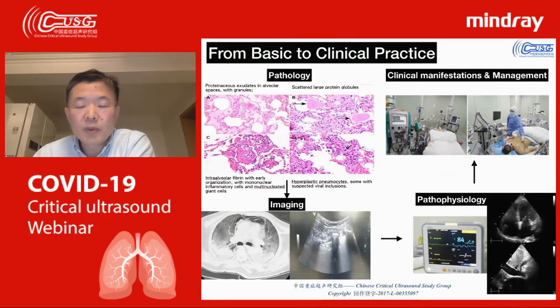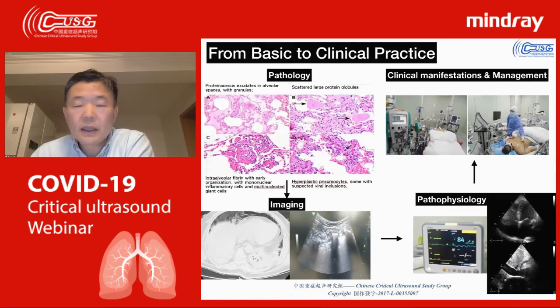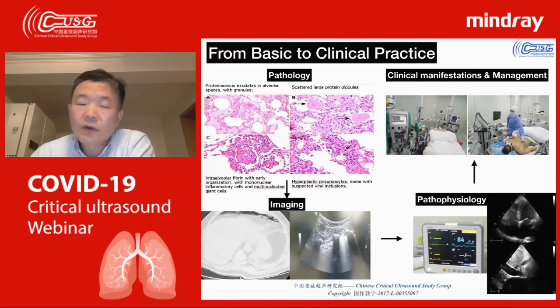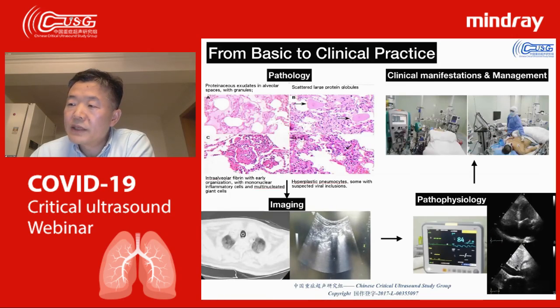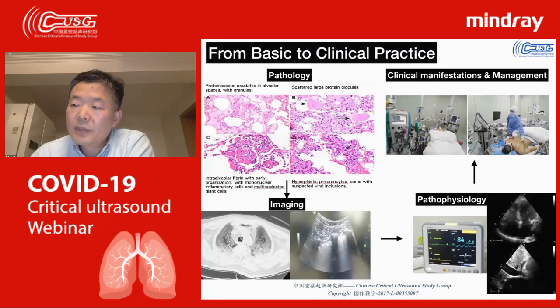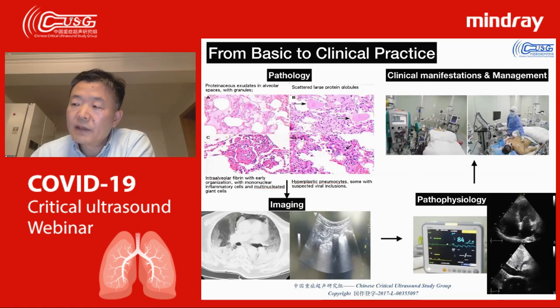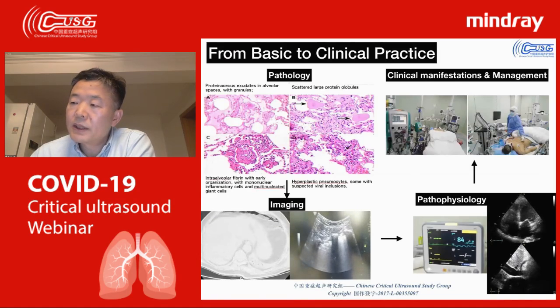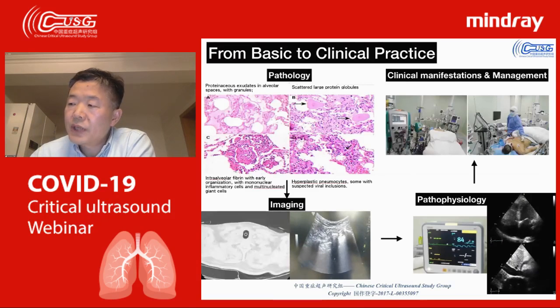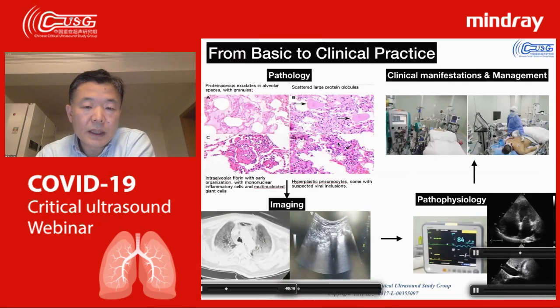It's a 48-year-old female patient with no respiratory symptoms such as fever at onset. The patient had lung cancer and underwent an operation, and the day after the operation, they did a CT scan and showed changes. The lower part here is very useful.